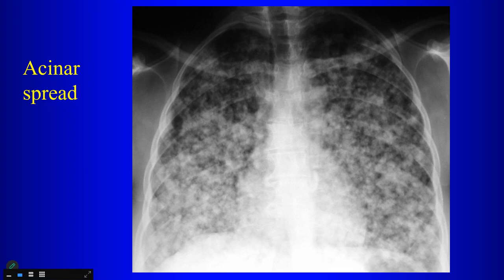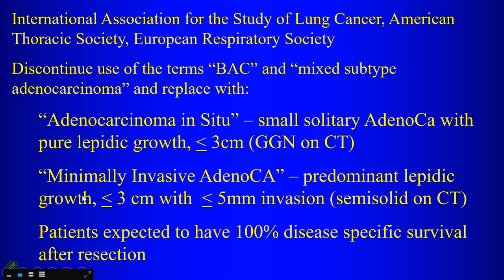If you see a chest radiograph like this, what are some of the first things you're going to think about? TB. Yeah. Well, is that miliary TB, first of all? Why? Multifocal pneumonia. Yeah, so the bronchial spread of TB, bronchopneumonia, yes. So bronchogenic dissemination of infection is the first thing you're going to be thinking about. So some form of bronchopneumonia, airway dissemination, bronchogenic dissemination of TB or another infection. So that's probably the first thing to think about if you see multiple nodular opacities like that that are kind of ill-defined airspace opacities. So these terms have been discontinued.